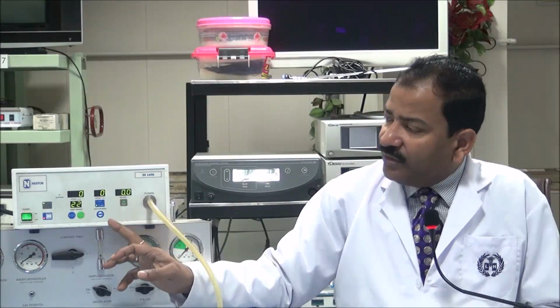But remember, if you are doing any extraperitoneal surgery and accidentally the peritoneum is pricked and gas enters into the abdominal cavity, then immediately reduce it to 15. Because now you are no longer allowed to continue at 22. You will be in trouble. So this is the maximum limit for extraperitoneal.